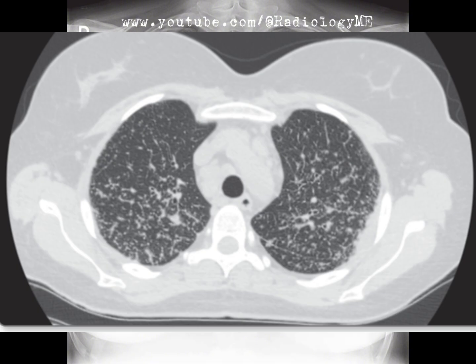On the axial CT, we see multiple tiny nodules, particularly concentrated around the fissures. That nodularity of the fissures is a classic hallmark, isn't it? And there's clear mediastinal lymphadenopathy. Those enlarged nodes are scattered, making it harder to ignore the possibility of an underlying granulomatous process.